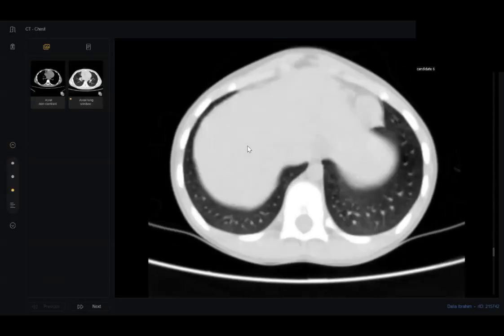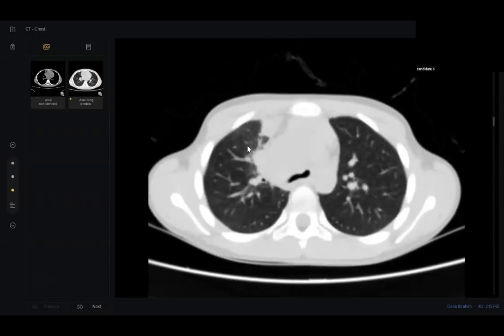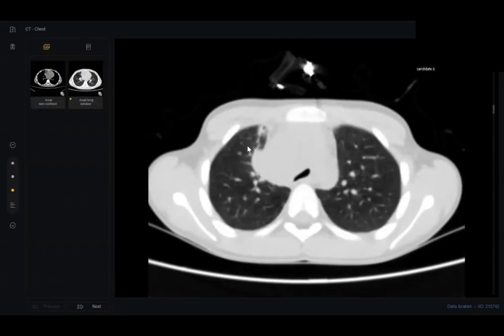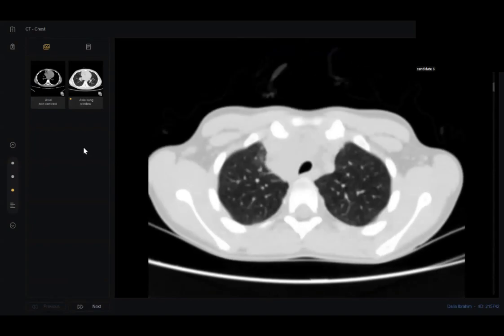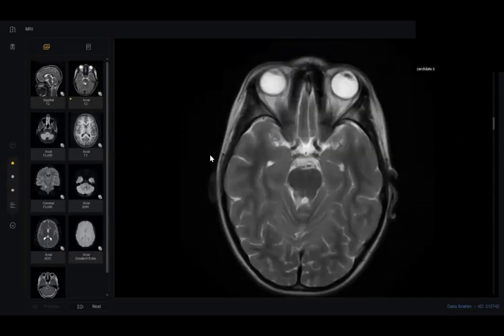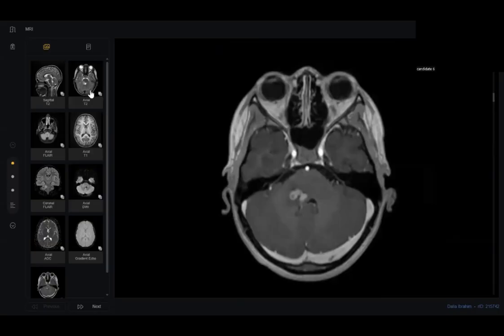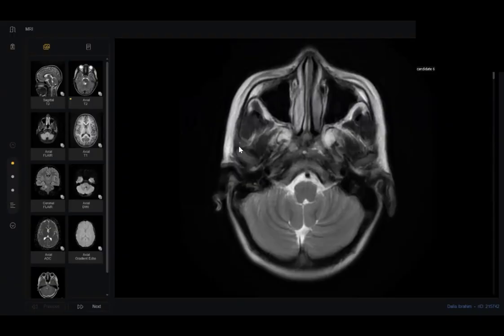This is the CT scan, HRCT scan, axial slices of chest, lung window. What's your diagnosis? So there is airspace consolidation with nodularity in the right upper lobe. So what is your diagnosis here? Most likely, sir, tuberculoma. What will you do next? So patient needs to be isolated and contact screening should be done and infectious control authorities should be informed about this patient, and patient needs to be isolated and treated medically.